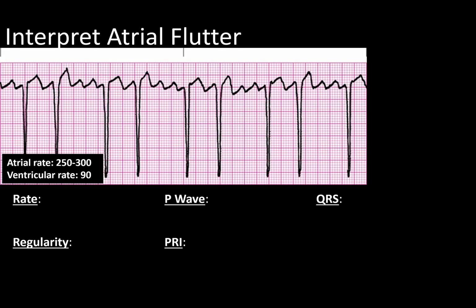All right, so for a bit of a challenge, we'll look at this like usual. We've got that and that, and just staring at it from the back, it's irregular for sure. There is a bit of a pattern though. It looks like 2 together, space, 2 together, space. So we'll ask if there's a pattern. There's no ectopics.